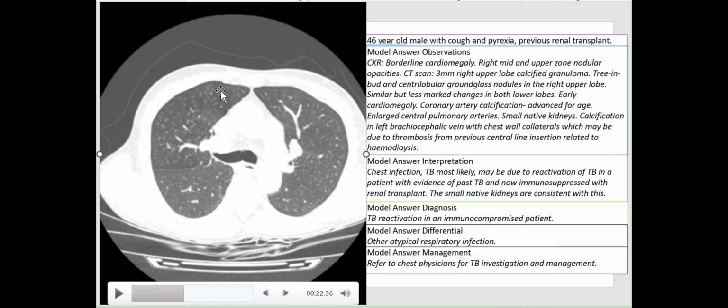It's not the same as this lung, it's another color. Can you see the difference? This is the ground glass opacity. So the centrilobular nodules along with the ground glass opacities seen here, this is called centrilobular ground glass nodules. Okay, it's a kind of mix.